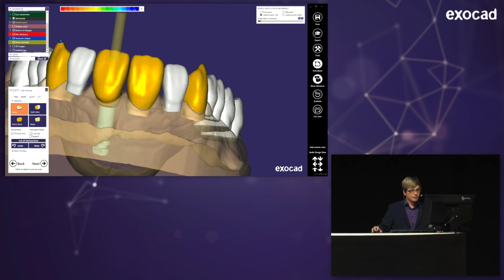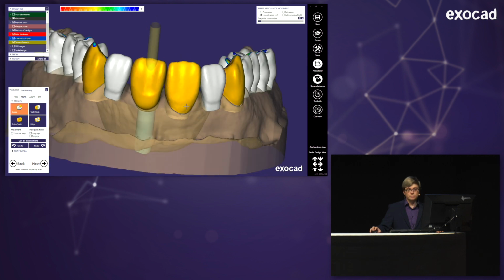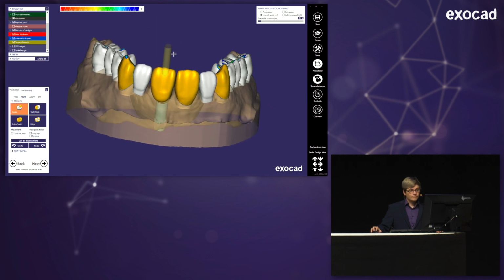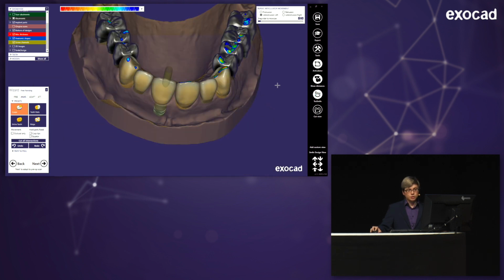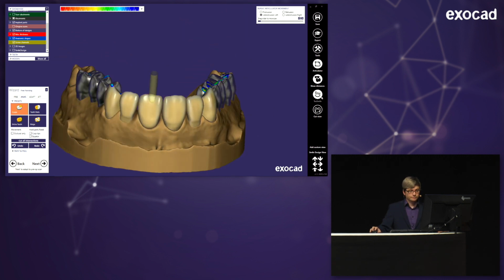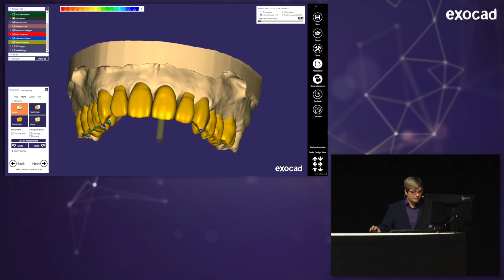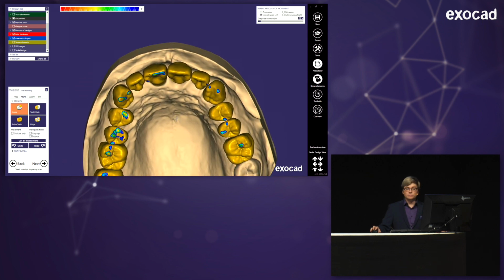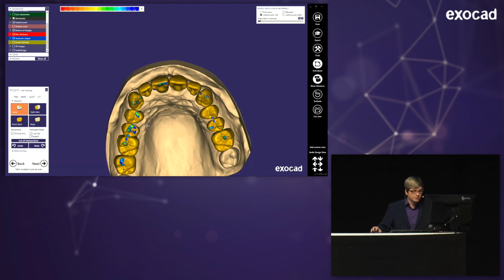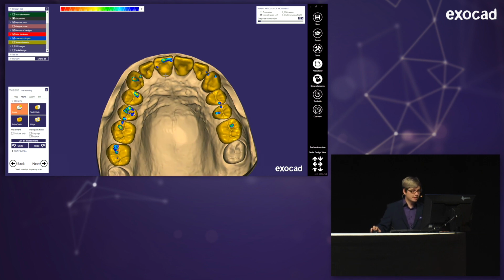And all of the anatomical teeth get connected to their crown bottoms. You can actually activate the True Smile again, and you see all of them in the same color for the moment. Deactivate it. And now, I'm going to hide the screw channel here. I can freeform those teeth. I mean, most of you might already know the step freeforming. Or else you might have not used the exocad until now.